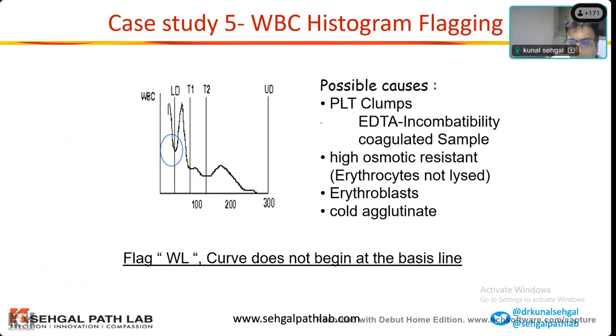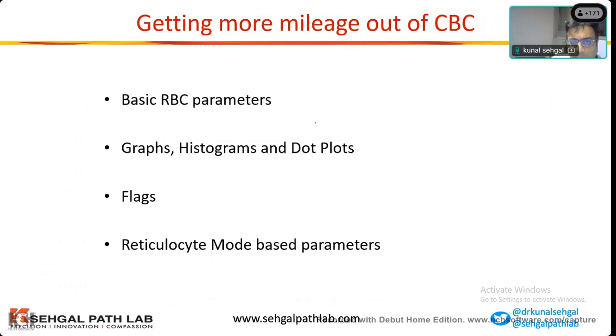Now we will discuss moving from 3-part to 5-part analyzers. When we go into 5-part analyzers, remember that the RBC and platelet histogram principles remain exactly the same. There is no difference between the principle of histograms.